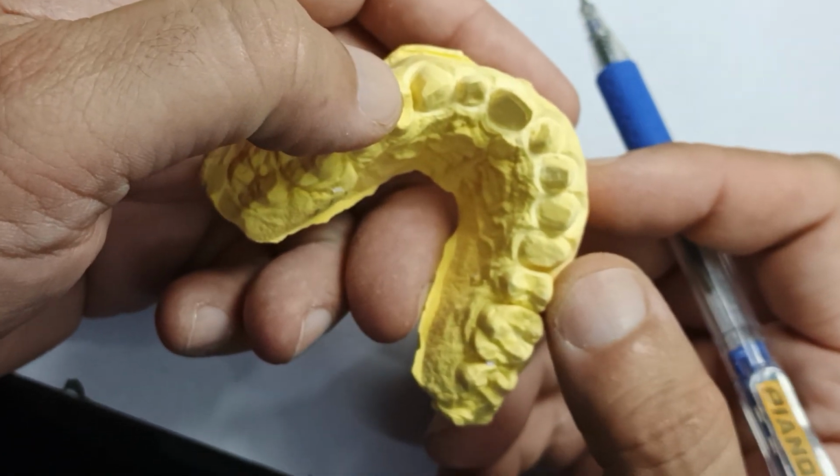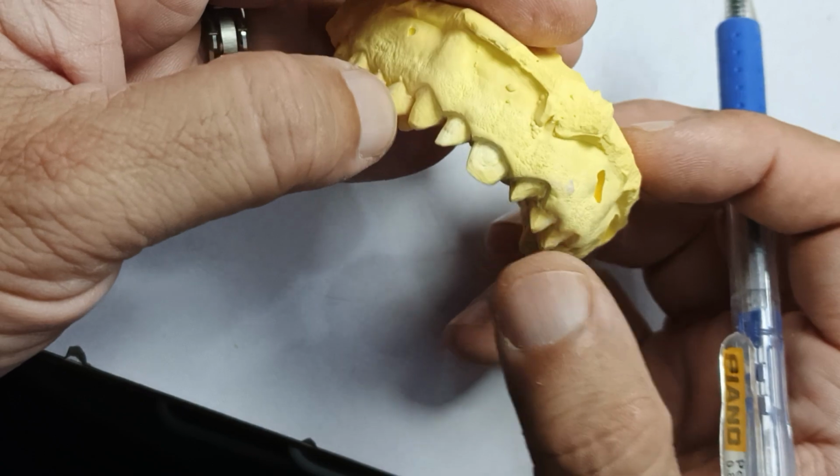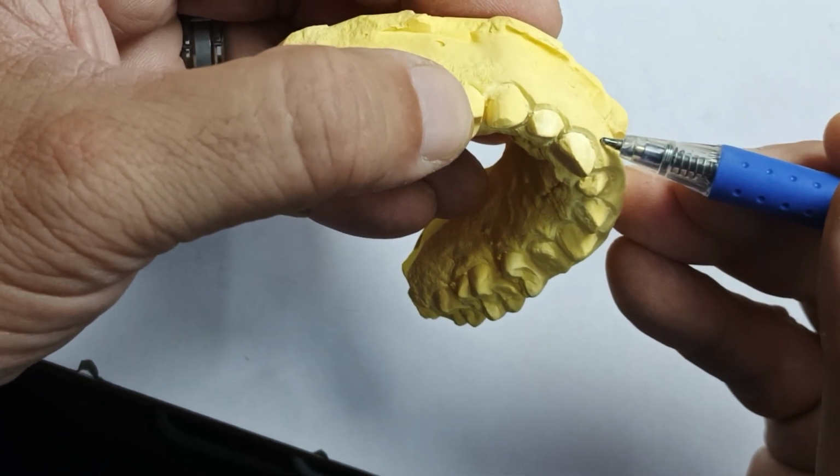Did the patient actually need crowns? Maybe they just had space. Maybe composite is all they needed. And these are all conical crowns. And the lab cut the stone right there to make the margins.